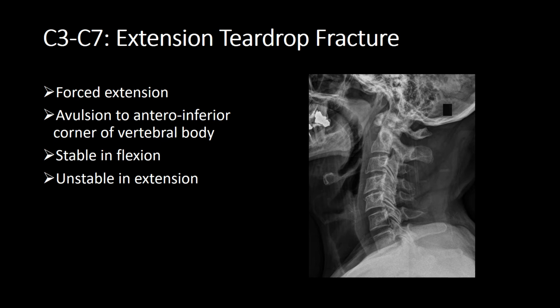Okay, so A is for adequate, S is for soft tissue, A is for alignment. So we come down the clivus, which points to the posterior cortex of C2. So we go down our anterior vertebral line, and we can see that there is a disruption to the cortex there. But if you actually look at alignment, the vertebral body of C2 still remains in alignment with the vertebral body of C3. Sorry, the vertebral body of C3 remains in alignment with the vertebral body of C4. Vertebral bodies C5, 6 and 7 are all in alignment. So your anterior vertebral line is actually in alignment.